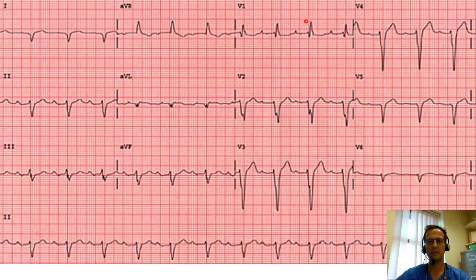But it is predominantly R wave in V1, so it is right bundle branch block. And in fact, can you see there's an RSR pattern in V1? So this is right bundle branch block. But look into V2 and you've got your W, this fractionation we talked about. It's not only a V shape, it's also got fractionation.